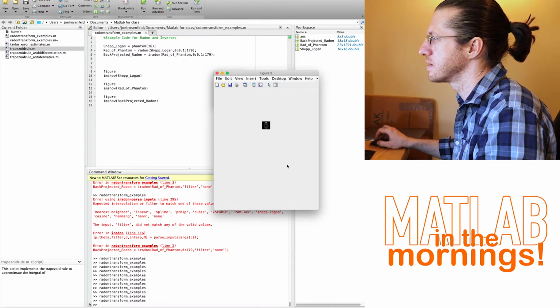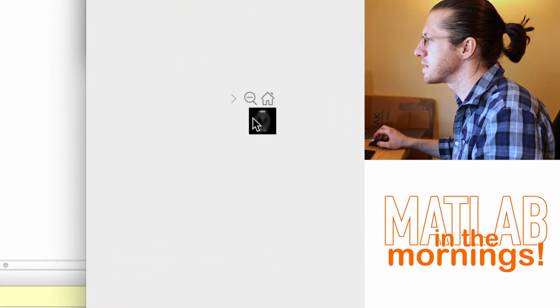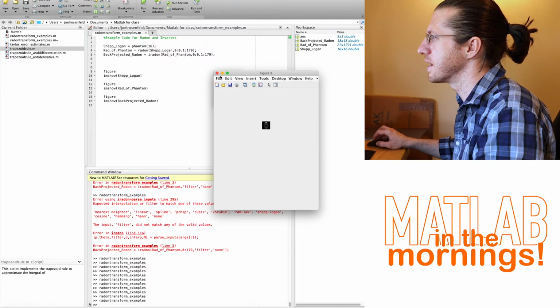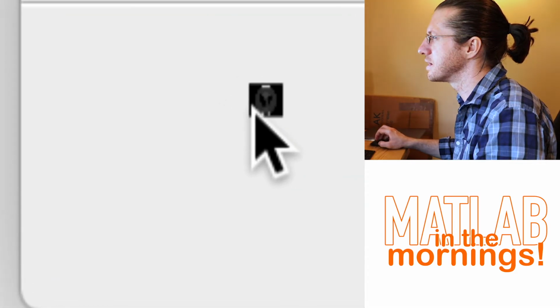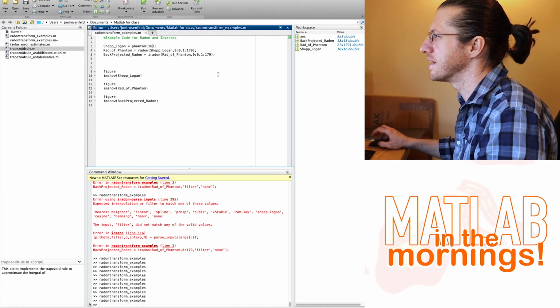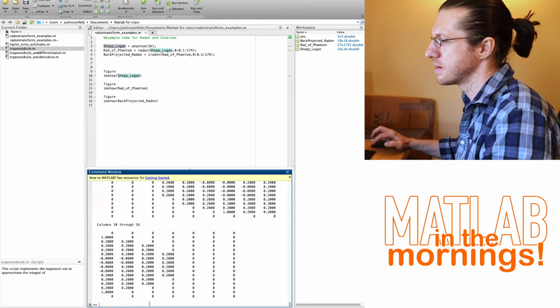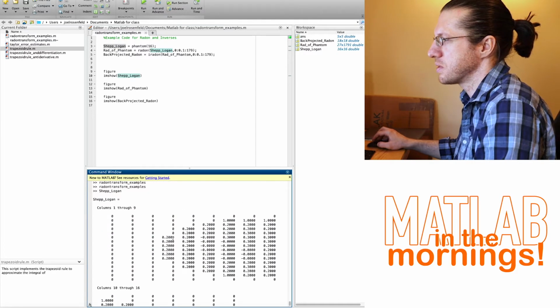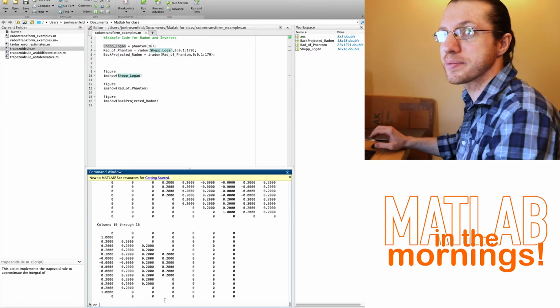It's not doing very well as far as increasing that. But basically, it's a tiny little Shepp-Logan guy we have in here, and ditto over here. It's really, really tiny. Okay, but if I go ahead and plug in Shepp-Logan and see what it is as a matrix, that's what it looks like. So these are all my blacks, and then these are grays. We have a couple of whites in here at 1, and so it's a gradient between 0 and 1.